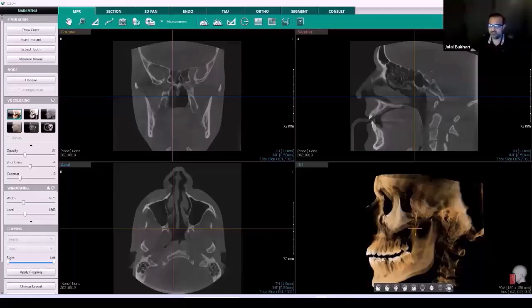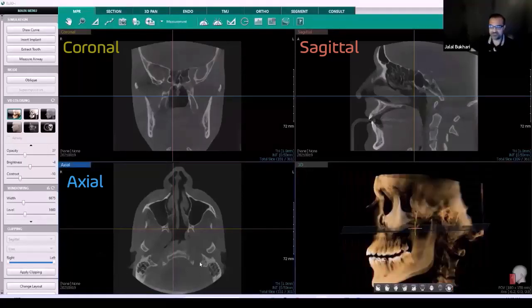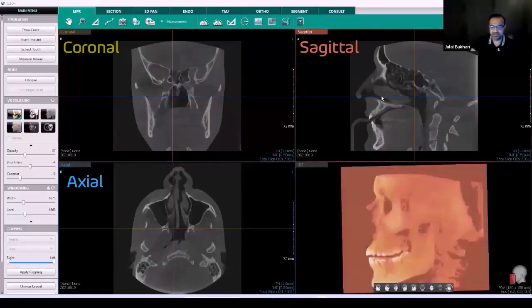Typically in radiology, we view three orthogonal planes. Number one is the axial, number two is the coronal, and number three is the sagittal. There's also a way that I like to run through the scan itself in these same planes of view. The first one we can look at is the axial view. Before I delve into that, I also want to mention that we have different color-coded bars on the different sections.